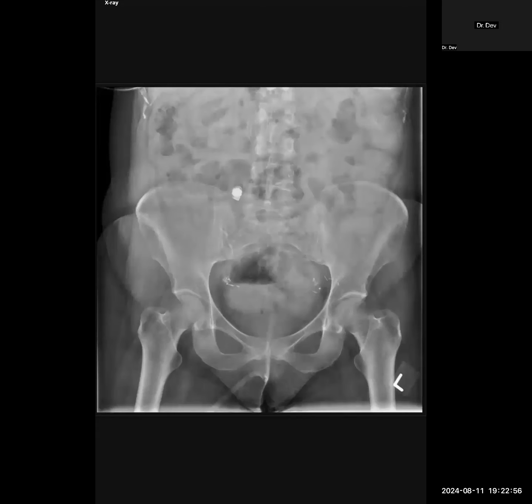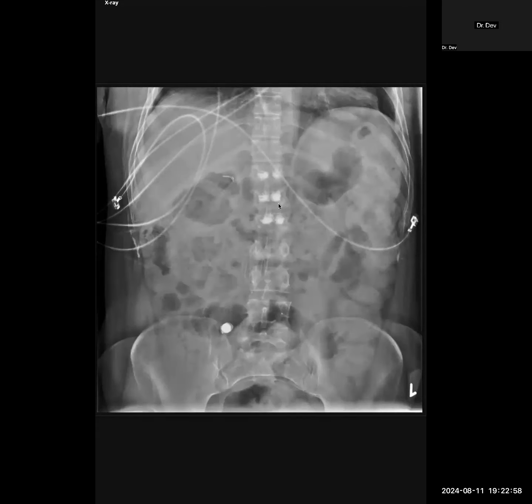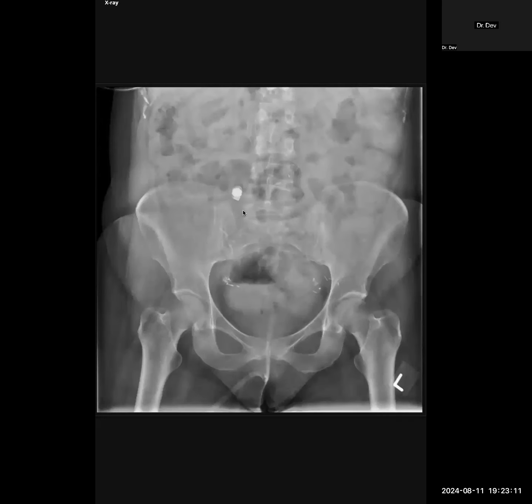And the other thing is, in this case, these are distractors. The vertebroplasty and the IVC filter are just there, and they're distracting you from what is actually a case of Crohn's disease with cholecystectomy clips, multiple previous surgeries, and this patient had adhesion, intestinal obstruction.